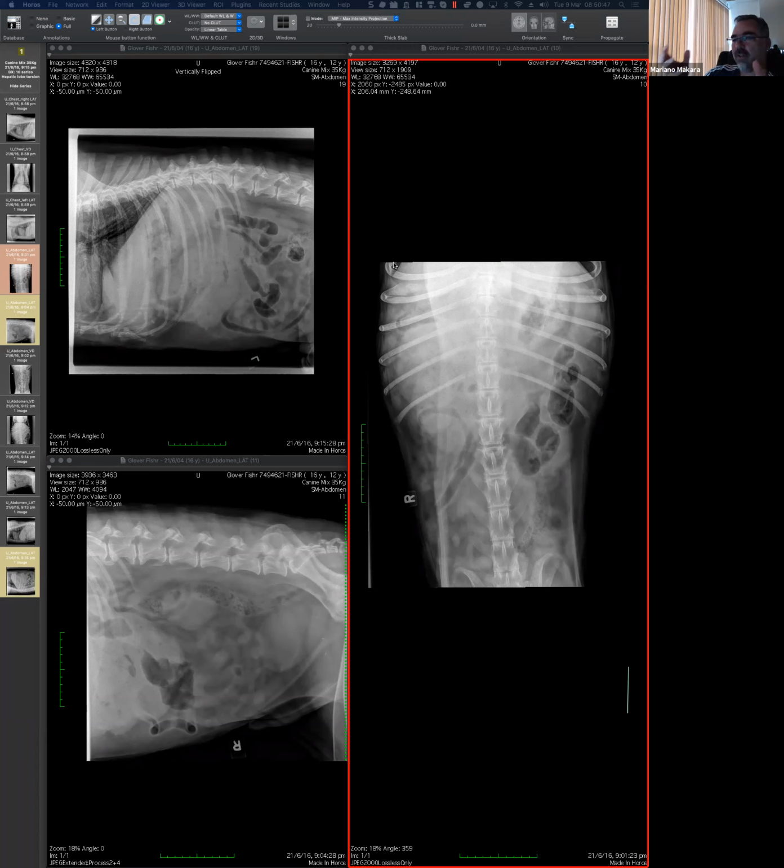Now our attention is all about trying to figure out what's going on, trying to share what we see, and more than anything that sharing, so others can agree or disagree and draw on top. I don't care about that. I think the ability to draw and to share what you think and how you see is very important. So it's very important that everyone feels comfortable drawing on the images and explaining what they see.